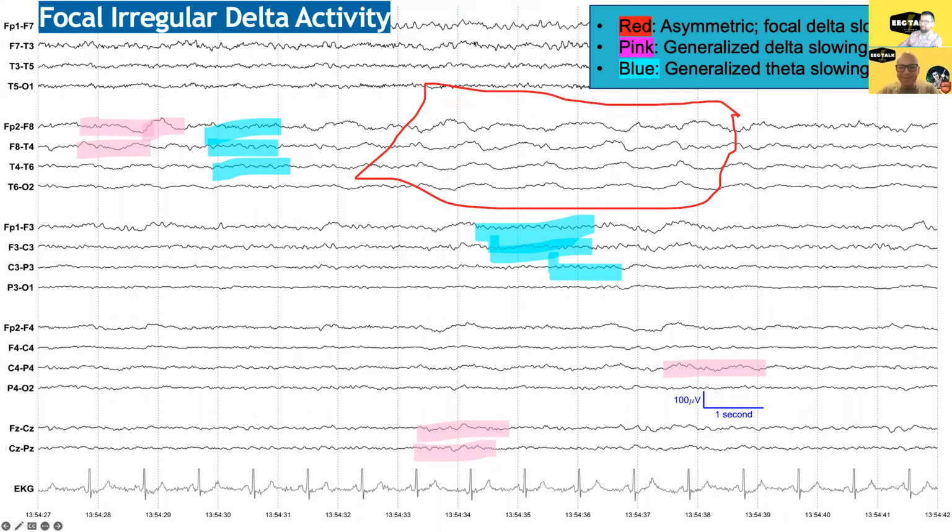Comparing both chains here, we usually try to compare the temporal chain to the other temporal chain, the parasagittal with the other parasagittal, and to the midline there. To make it fair, you have to be fair. So compare these two, the left temporal and right temporal.